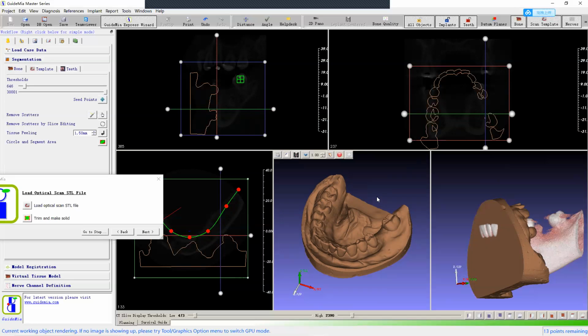One question, for the CBCT data, what voxel size do you prefer for these programs? Because most machines will do some sort of high resolution or low resolution. What type of voxel size do you require? Typically, nowadays the typical values we see are something like 0.2, 0.15, or even lower. They are all good.